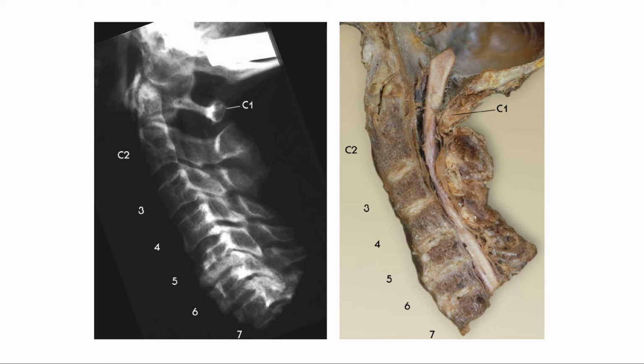When you mess with the spine and the joints and the tissue around it, you're going to mess with the cord. And this is going to decrease your quality of life, decrease immune function, decrease sleep, increase pain, increase pathology, and so on. Okay, so you're seeing the bulges, you're seeing degeneration, evidence of chronic inflammation and so forth, that it's really hurting that spinal cord.